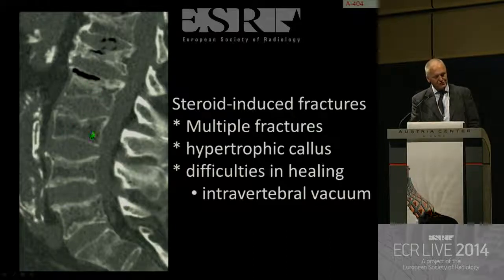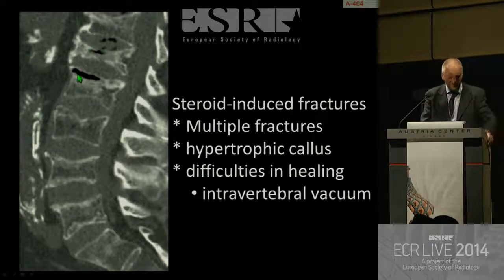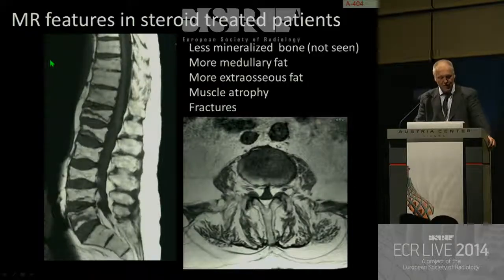Look at the trabeculae that have gone away. You will see the multiple fractures with callus formation and difficulties in healing with intraosseous vacuum phenomenon, some sort of pseudoarthrosis, which are related to the difficulties in healing of these patients due to steroids.